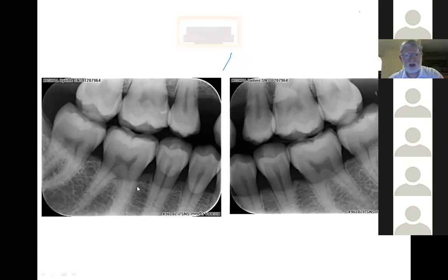We're probably looking at lingual buccal or buccal lingual coming across there. There's been a fair amount of abrasion, restorations that have gone in, but quite a lot of bone loss. It doesn't appear that there's any active bone loss happening at the moment, because you'd expect to see some thinning out of the alveolar crestal bone.